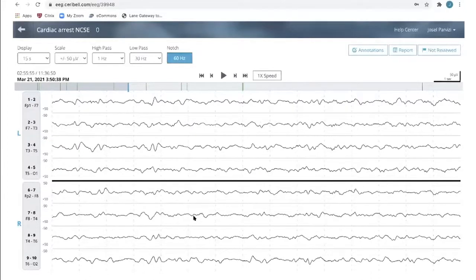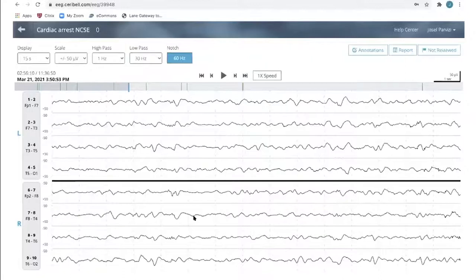Yeah, and a lot of these treatments, this is still an ongoing EEG today, and the beauty of the Ceribell, at least for a private practicing neurologist, is that I can place orders in the chart saying if the Ceribell is flashing red, reading continuous seizures, because I know that in this patient this is going to be fairly accurate, we can go ahead and apply PRN treatments that the nurses can do.